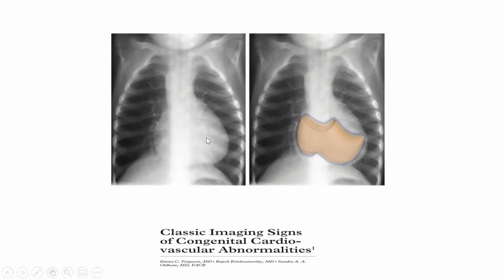So the heart is elevated, and because in tetralogy of Fallot we have what? We have pulmonary atresia, right? Pulmonary stenosis. And in the pulmonary stenosis, the kink here, which is occupied by the pulmonary artery, is constricted. So you see that the heart is big here or elevated, and it is concave here.